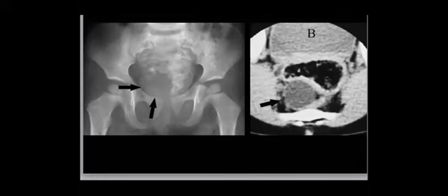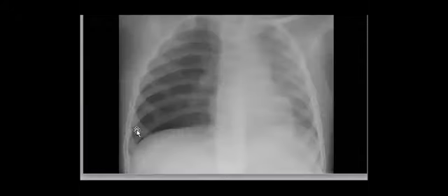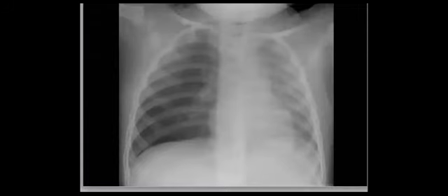Reem, perfect. I see many new stars, plus Nirmeen and Marwa and Ala. Yeah, mashallah. So let's go to another case. Frontal radiograph in a pediatric patient. How do you describe it?